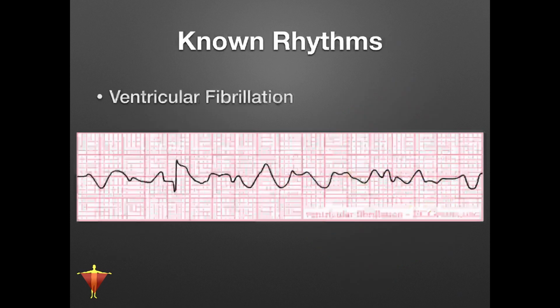Let's get into some of these. Let's get into some of the rhythms that we should be able to readily identify. And so let's take a look at this very first one. So what does this look like? Well, it looks like an unorganized, chaotic rhythm, right?